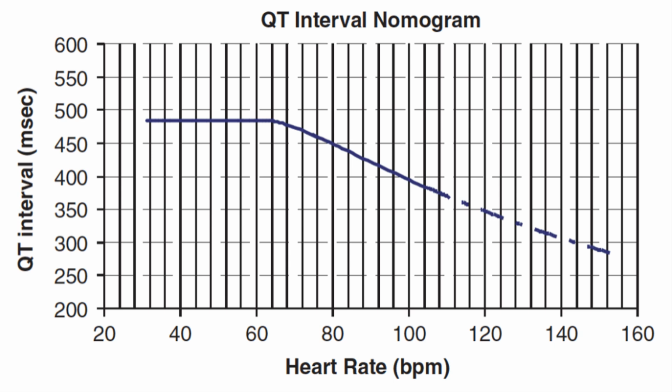So tachycardia with QT interval prolongation at lower increments are more of a danger to go into torsade. And again, anything above this line has a patient at increased risk of going into torsade.